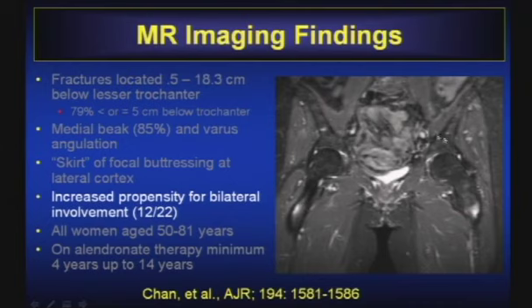So as you're looking at this fluid-sensitive sequence, look at the changes at the endosteum. We're getting reactive marrow change here, chronic process perhaps, bilateral and symmetric. We're not seeing a lot of periosteal high signal intensity. We see no linear high signal intensity extending across the cortex, do we? Okay, so endosteal change along the lateral margin of the femur.